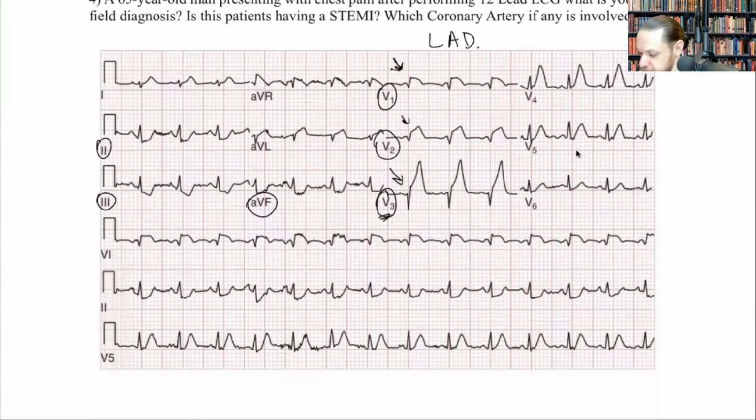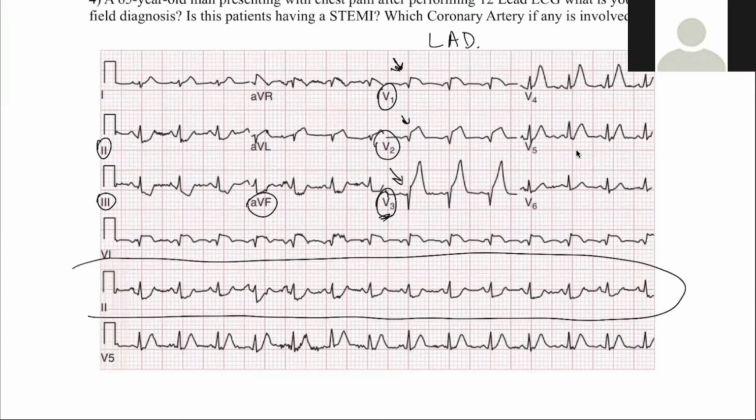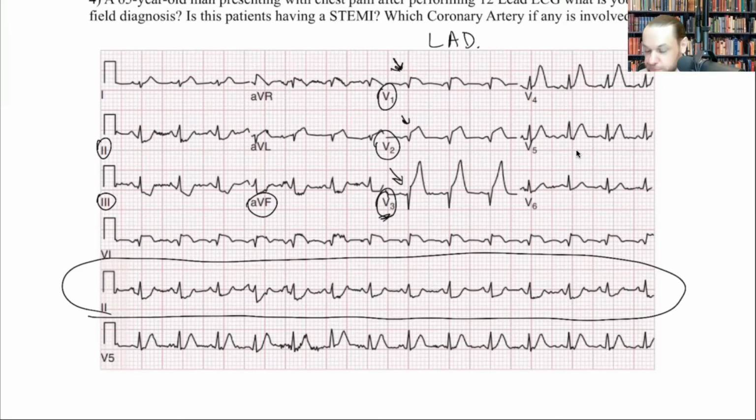What would be your underlying rhythm? Can you say, or is it too hard right now? Let's see. I see there's a P wave. It's kind of close. So that looks okay. It looks like it's firing, right? The QRS is kind of small. Yeah, that could be just the morphology and our rate.